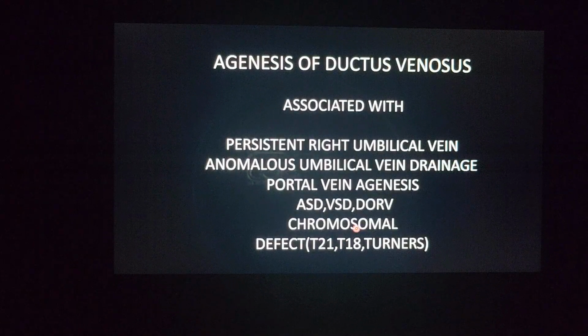In all these classifications, whenever there is ductus venosus absence, it becomes agenesis of ductus venosus.